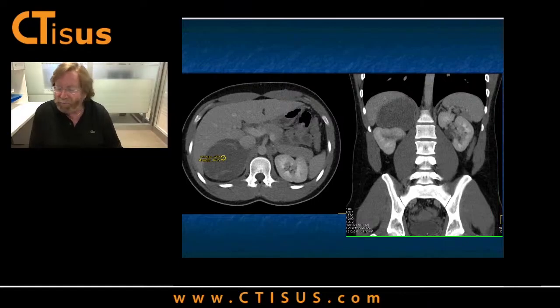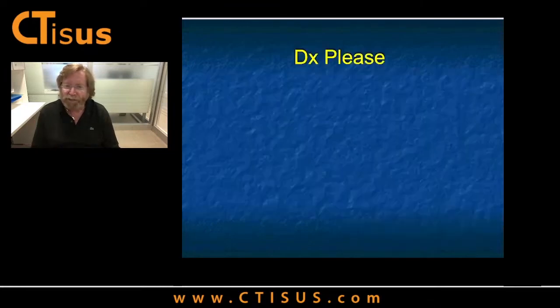You also can have other things like myelolipomas which can bleed. I don't see any fat here, but if this was blood, you can obscure the presence of fat. There are several unusual adrenal lesions which can be low density. Lymphangiomas, ganglioneuromas are in the differential. The thing is, in my heart, and probably your heart as well, you got a feeling this is benign, but it's not a leave-alone lesion. It would be something that would be taken out laparoscopically. So my question is, what is it?